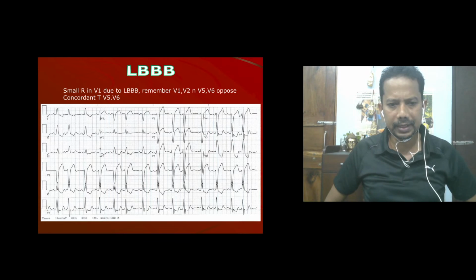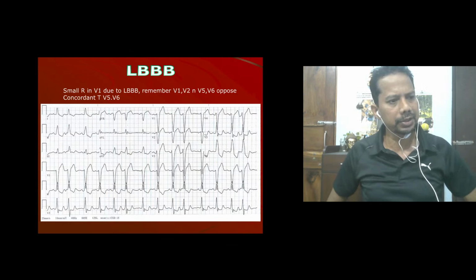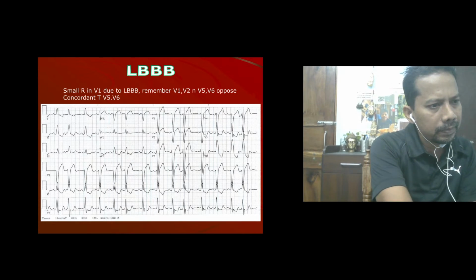I know this is a complicated ECG because there are a lot of ectopics happening. So you may skip the heart rate. Roughly the heart rate might be around, let us say, 75 beats per minute, but there are a lot of ectopics. This is a difficult question. Anybody? Dileshwar.